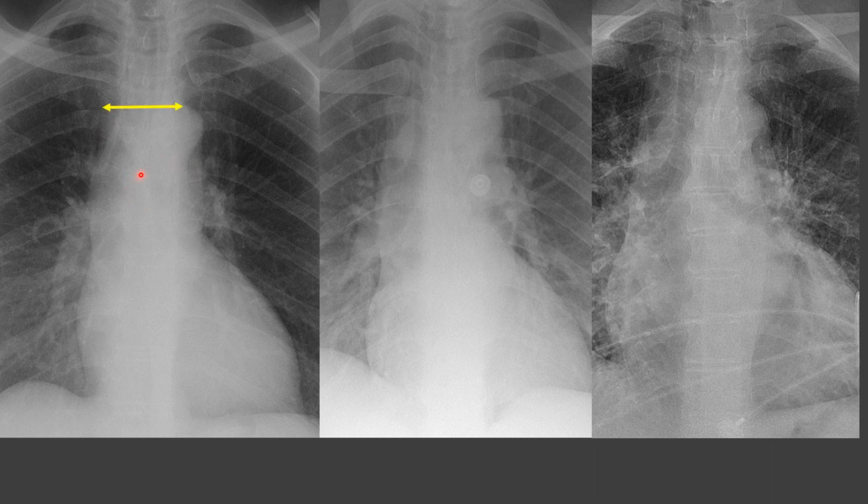We also want to look at the azygous vein. So where's the azygous vein at? The azygous vein lives in here. It's nice and small in size. Typically the azygous vein in an upright chest x-ray should measure less than 1 centimeter in transverse dimension. So you can see that the azygous vein is nice and small in size and kind of tucked away. It's barely visible.